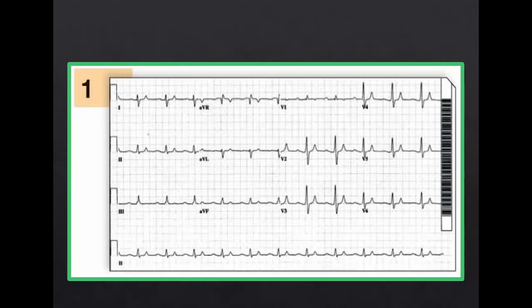Okay, so it's an ECG. I've got no name. I can see the duration of the time looks normal. The amplitude is normal. Looking at P waves, I see some P waves in V1, V2, very small. Looking at the axis. So I'm just going to stop you there. There's a first degree heart block there, right? Okay. You can carry on. Okay, so lead 1 and aVF are both positive, so it's a normal axis. It's negative. This is right axis, yeah.